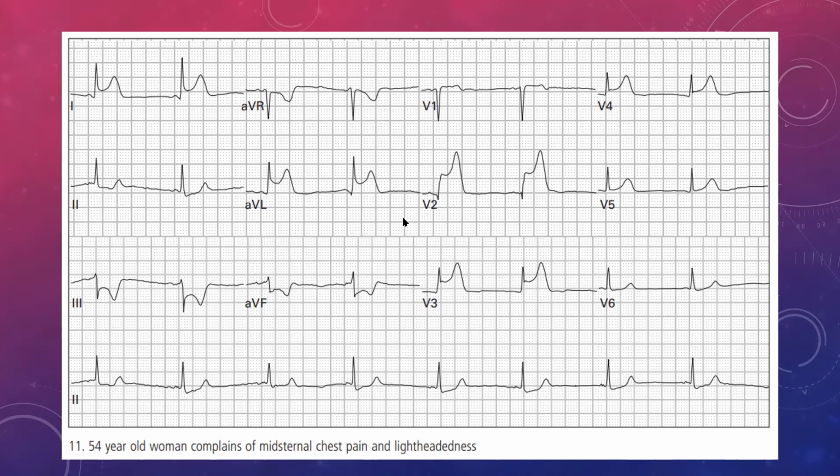So, this could well be that we have an atrium that's not functioning, or we've got a very poor atrial signal that's coming through, or whatever it may be. So we can't really talk about a PR interval. We can maybe talk about it here, where it falls within normal. Our QRS complexes are narrow.